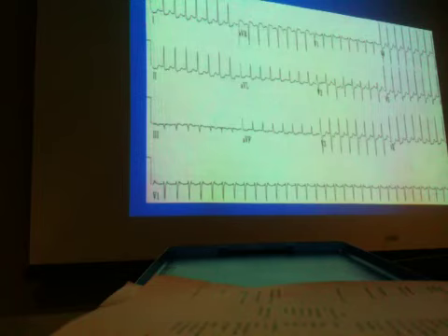All right. Now, because the heart goes so fast, it has a hard time filling itself. It has a hard time filling the coronary arteries. And so you can see things, which we'll talk about in a bit. You see where the ST segment is, this right here? See that little flat line right there? That's your ST segment right there as well. That should be up there next to the P wave. It should be in our imaginary line, and it's pulled down.